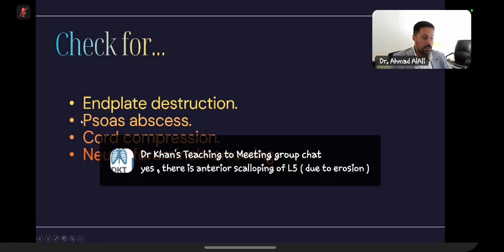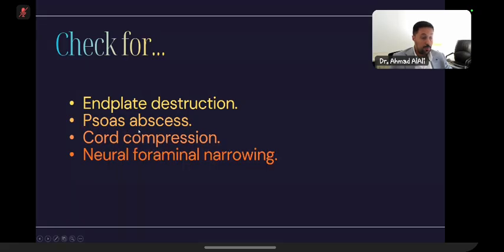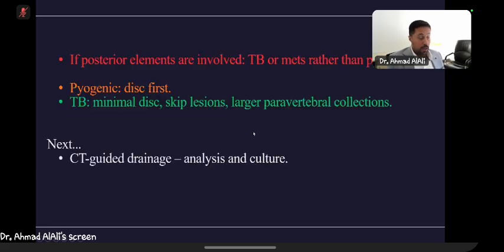The one thing that you need to add to your differentials and to your observations is presence of psoas abscess. Some infections in the spine tend to involve the psoas muscle as well, and I expected that from you. Screen through the axial images to inspect the psoas muscles and the paravertebral spaces very well, to see if there is involvement of any muscular abscesses. However, you've done very well indeed in describing and concluding the case.